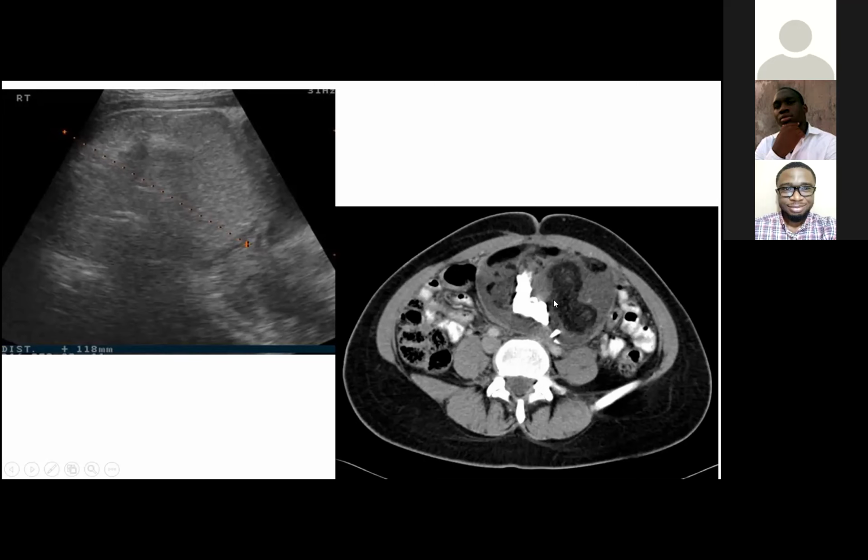And I think that was why people ended up doing a CT scan here. Whilst we did think it was a dermoid, I think there was some doubt whether it was actually the cause of the pain, because just because you have a dermoid and pain doesn't mean that the dermoid is the cause of the pain. You can have a dermoid and appendicitis. So ultimately, the CT scan was useful in confirming that the dermoid had indeed ruptured. And given that, we could then make a confident diagnosis that that is the likely cause of the pain, and then refer to gynecologists.